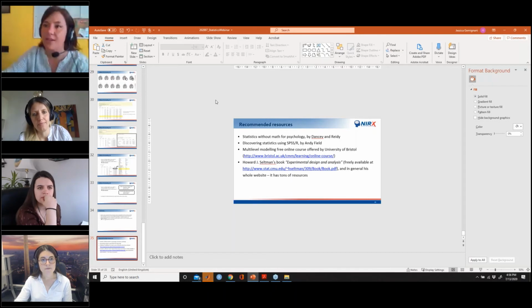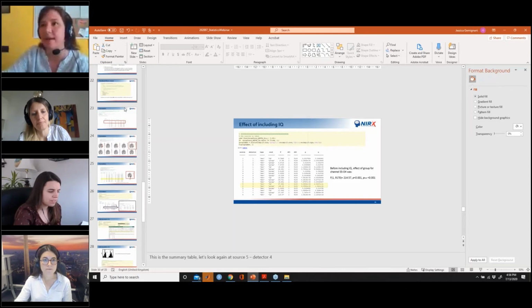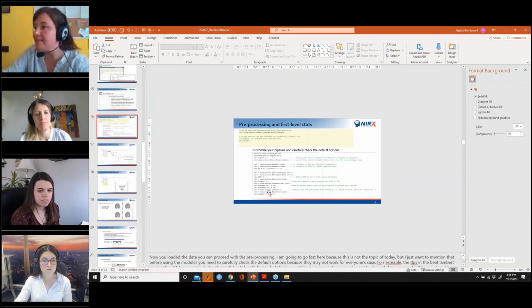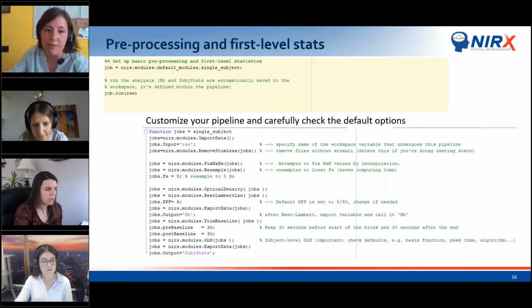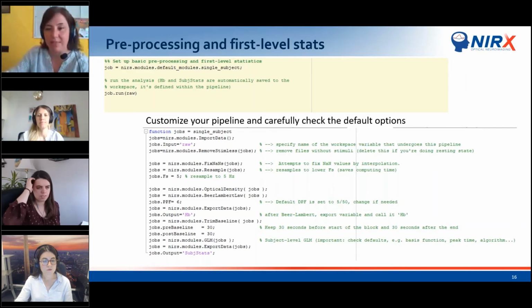I wanted to share, because I think I put a line on the resampling. Let me see here. Yes, I'm going to share my screen for 1 second again. So, for example, here you can call these NIRS.modules inside the pipeline. You call NIRS.modules.resample, and then you specify the new sampling frequency that you want. This is 2 lines, and it's going to resample there.